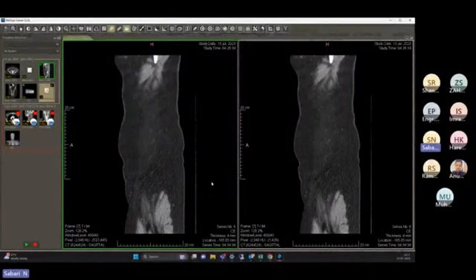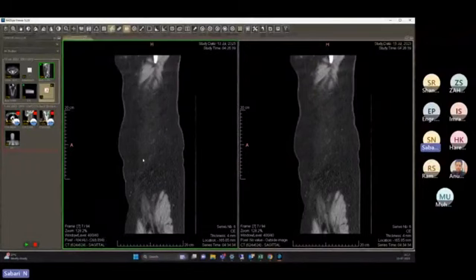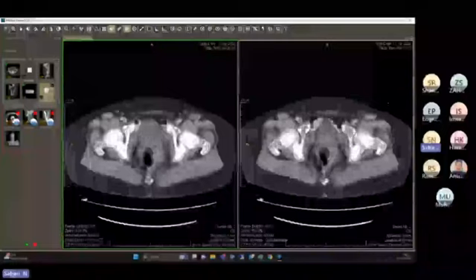So that is the advantage of us. You can directly do the WADO call, Web Access DICOM Object. It is called WADO. So directly you can view the images from my server. Once you close it, whatever temp file it creates will also be automatically deleted from the PC. So that is the advantage which we are using.